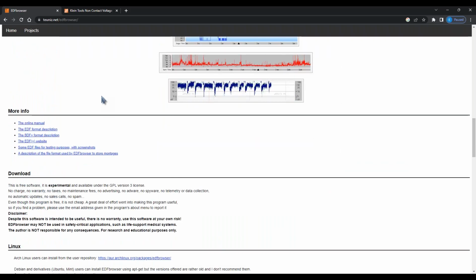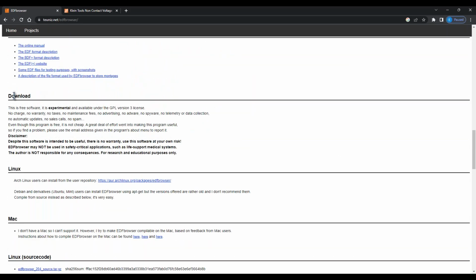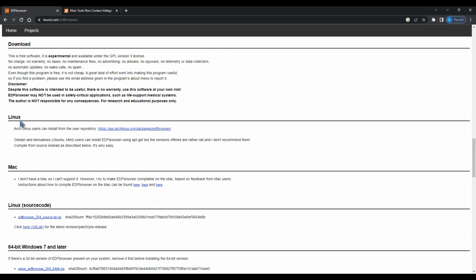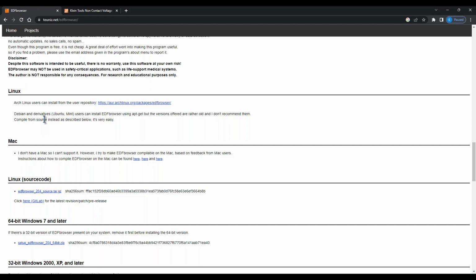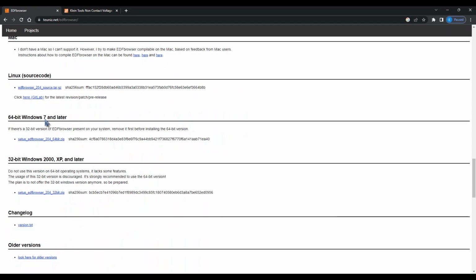Let's say you were running a specific session on a client and noticed some weird anomalies, and you wanted to play that session back and look at it in detail. There are a couple of steps you have to do to accomplish that.